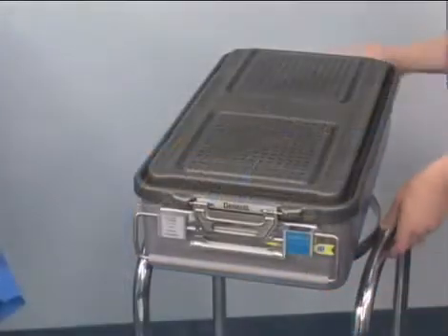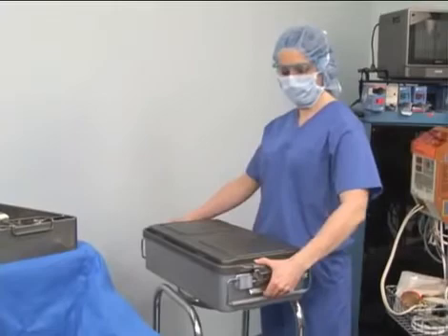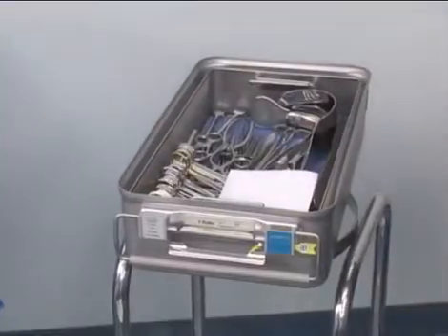As sterile items are opened, use more tables if necessary. Do not stack heavy sterile instruments precariously high or in such a way that they might be dropped. Avoid holding a heavy instrument tray in one hand and removing the wrapper with the other. This puts excessive strain on the wrist and you may drop the tray. Put the tray on a non-sterile table before opening the wrapper.